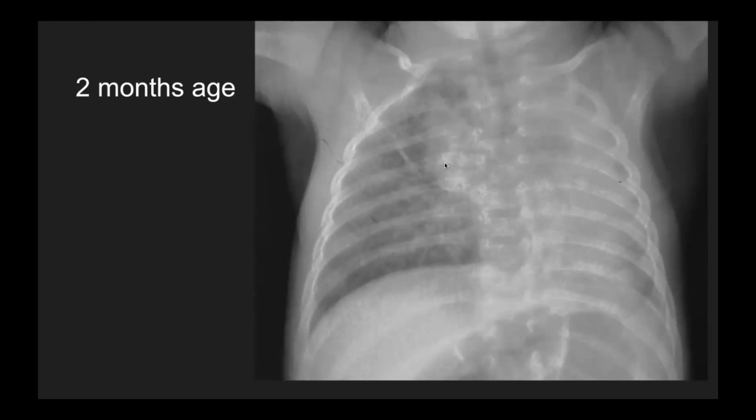In a very small kid in whom agenesis seems unlikely, and the child shows an opaque hemithorax with ipsilateral mediastinal shift, yes, one possibility might be a mediastinal mass which is causing left main bronchus compression, or let's see what it was. In such a case, when there is a history that the child had a preceding viral infection, it always pays to see the previous radiograph. So let's have a look at the previous radiograph.